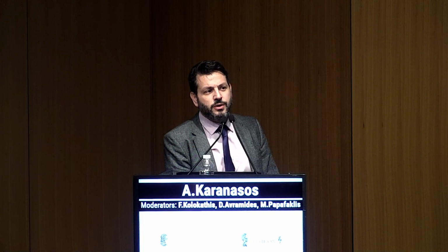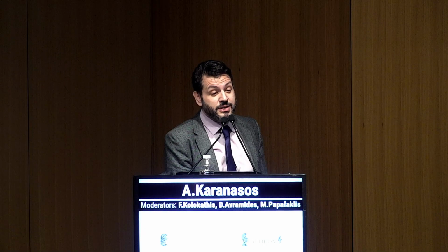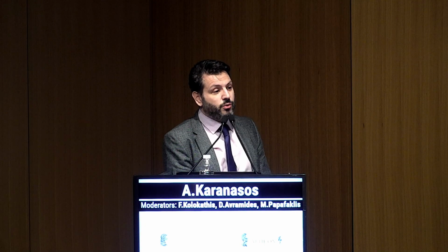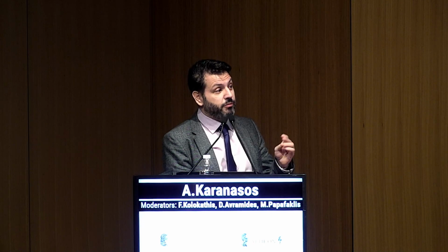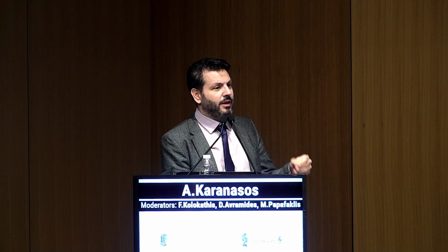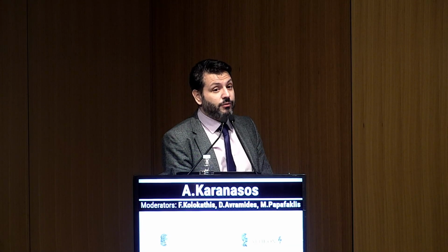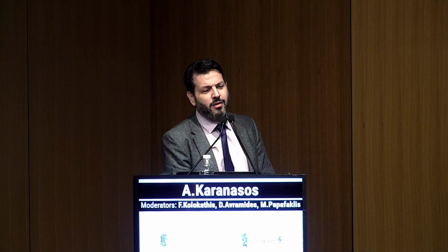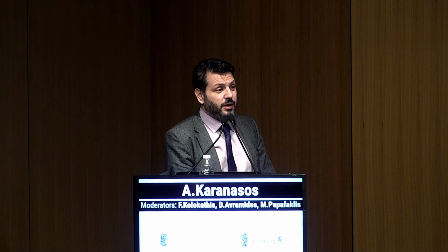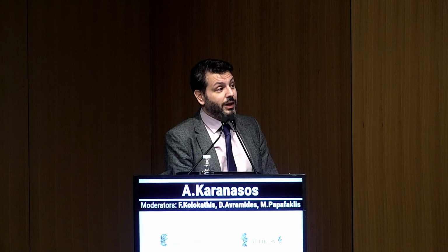Thank you, Michalis, for this question. Indeed, having good conditions is essential in OCT for good imaging. The first thing we have to do is always secure that the inside of the catheter is purged before its pullback, so that we do not see any gray material that corresponds to blood accumulating within the catheter. The other thing is to ensure that the guide catheter is well engaged to the coronary ostium. If we have a good engagement of the catheter, we do not even need a very high flow rate. We can do an LCA with 3 ccs per second. I think this is the most essential thing in having a good quality pullback.